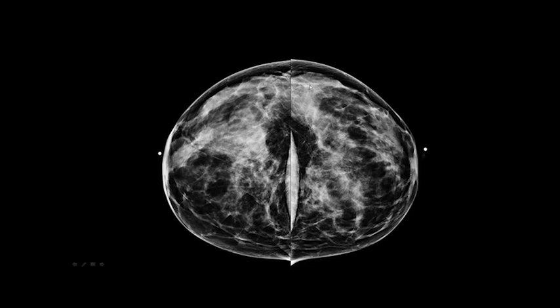They're going to look for the pectoralis muscle here and all the retroglandular fat, which should kind of make a circle. They're going to see if the medial tissue is on there without folds and the lateral tissue without folds. They really want to see the end of the parenchymal pattern here. That's what we're talking about laterally.